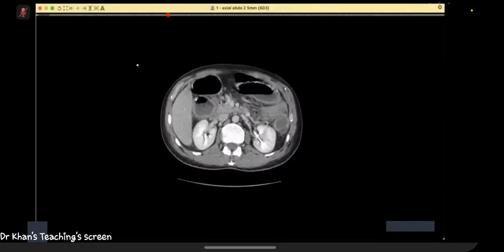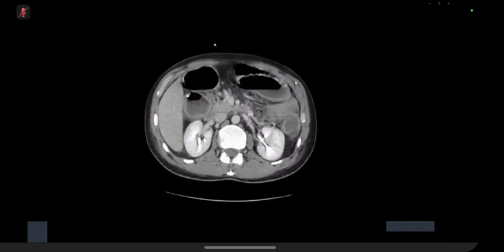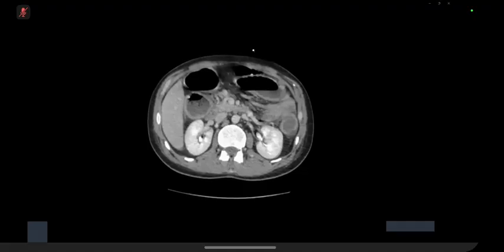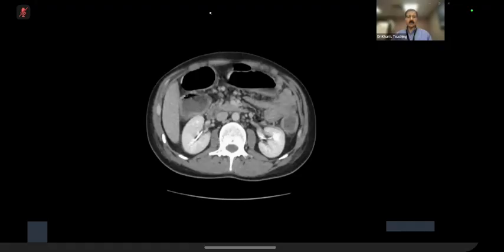It's not. Just click first on the image. Just click once on the image, and you can use the button up and down. How to remove the magnification? This is doing magnification. Can you scroll for me, sir? Okay, I will scroll for you.